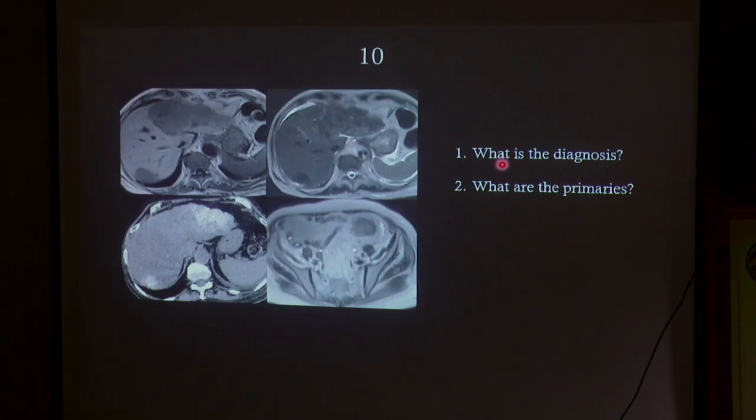So we go to the next case. We provided T1, T2 weighted and CT images. There's another image here. So what is this? What is the diagnosis? So, multiple irregular lobulated T1 and T2 hypointense lesions in both lobes of the liver, which on CT show calcifications.